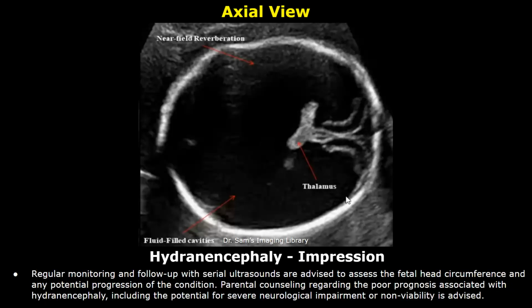Regular monitoring and follow-up with serial ultrasounds are advised to assess the fetal head circumference and any potential progression of the condition. Parental counseling regarding the poor prognosis associated with hydranencephaly, including the potential for severe neurological impairment or non-viability, is advised.